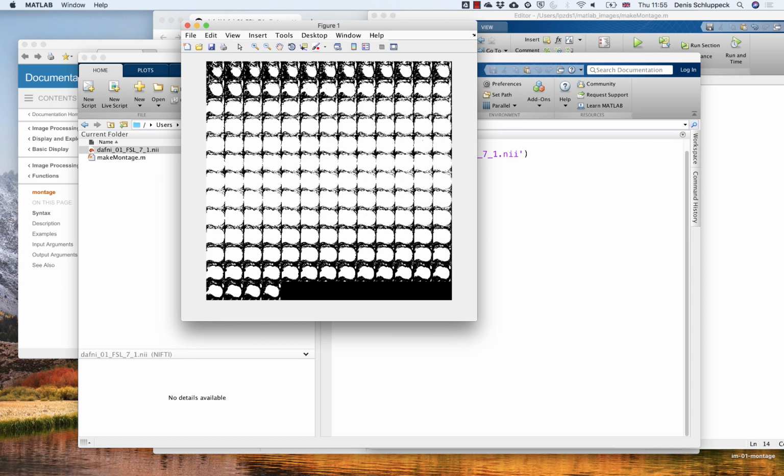So it looks like it's a whole sequence of images, but the first thing you'd notice is that the colors are completely bled out, and that's because in our data set there's some pixels that have very high intensities, and so we've only got a limited number of gray values, 255, and so the intermediate range of gray values don't get shown up properly because we need to also display the highest value. Okay, so let me show you a way in which we could fix that.